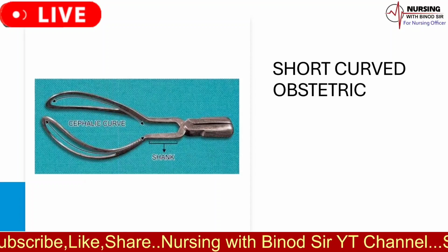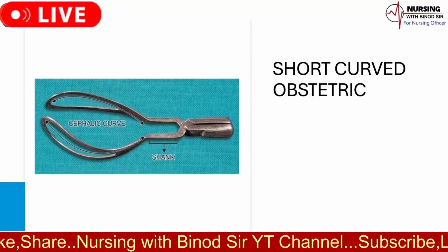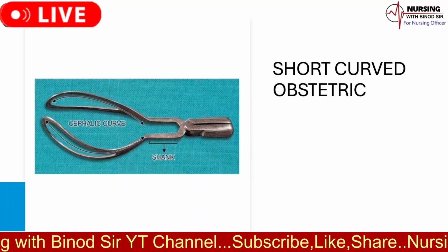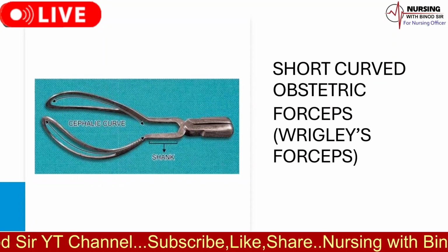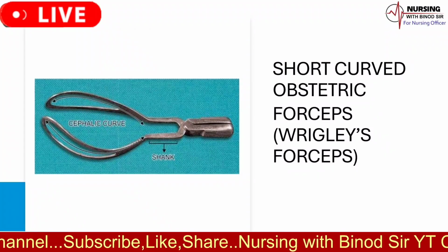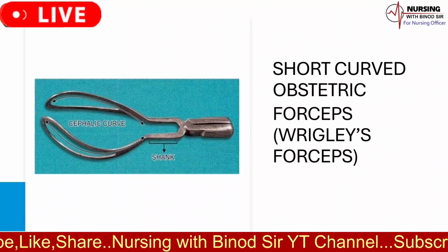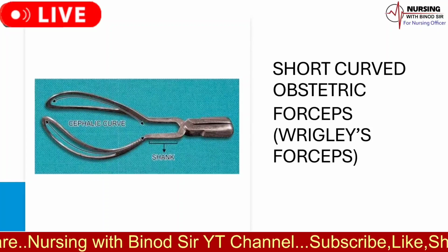3. Suturing assistance. To assist in holding tissues or sutures while suturing. 4. Wound closure. To grasp and close small blood vessels or tissues before tying ligatures. 5. Dissection. To separate tissues in surgical fields, particularly in confined or curved areas. 6. Foreign body removal. To extract foreign objects from bones or body cavities.